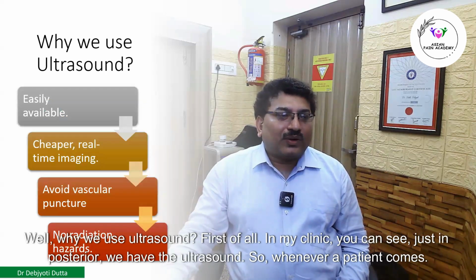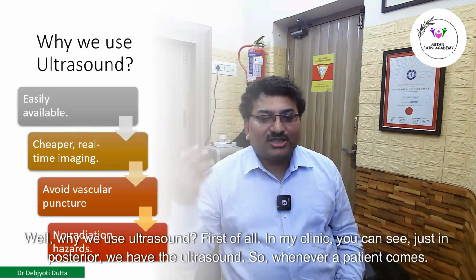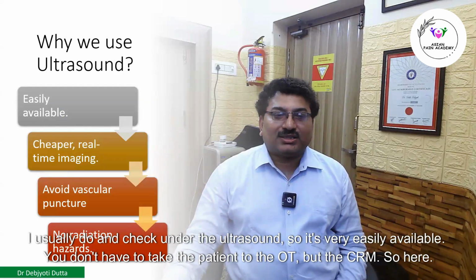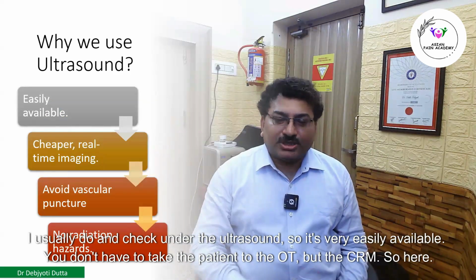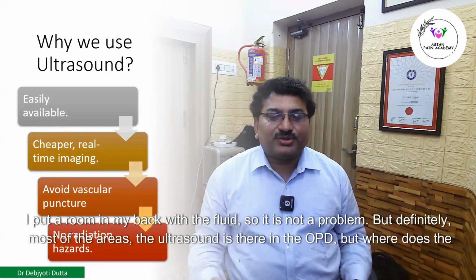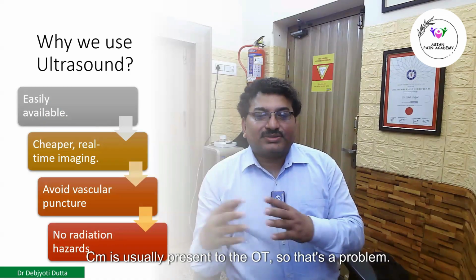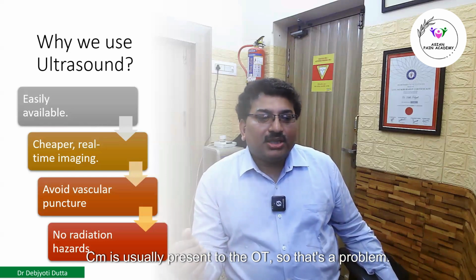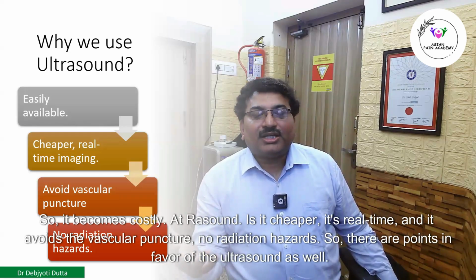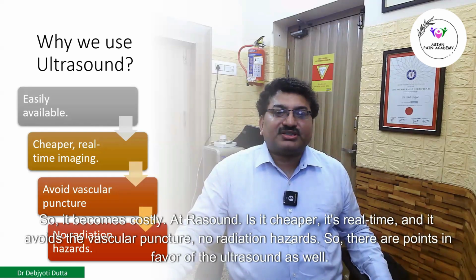Now, why do we use ultrasound? First of all, in my clinic, you can see just in the posterior, we have the ultrasound. So whenever a patient comes, I usually check under the ultrasound. So it's very easily available. You don't have to take the patient to the OT for the C-arm. Here I have a procedure room in my back with the fluoroscopy, so it is not a problem. But definitely in most areas, the ultrasound is there in the OPD, whereas the C-arm is usually present in the OT. So that's a problem. So it becomes costly. Ultrasound is cheaper, it's real time, and it avoids vascular puncture, no radiation hazard. So there are points in favor of the ultrasound as well.